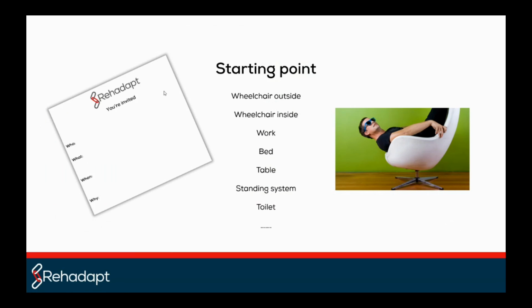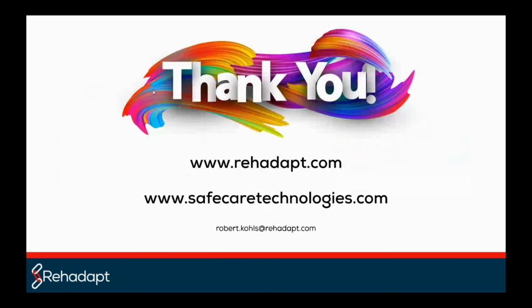So bring yourself into the situation. Ask yourself, where do I need the tablet if I were the beneficiary? So I hope this was a short insight into the world of tablet adaptations.